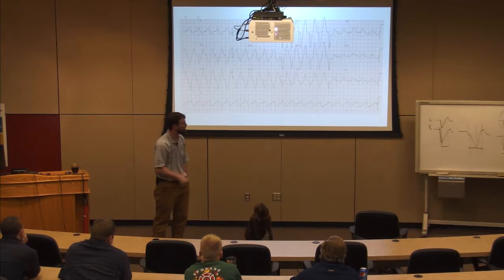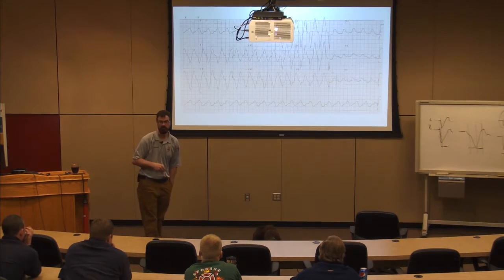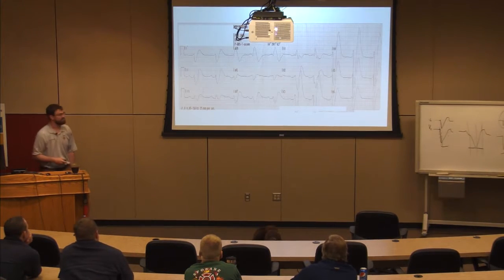It doesn't fit a left bundle. It's bizarre, and I have a prominent R wave. Make sense? How about this one? Oh, that's a good one.